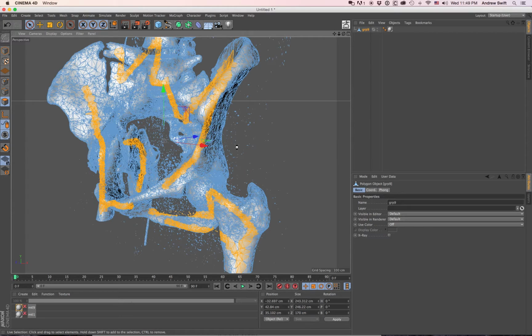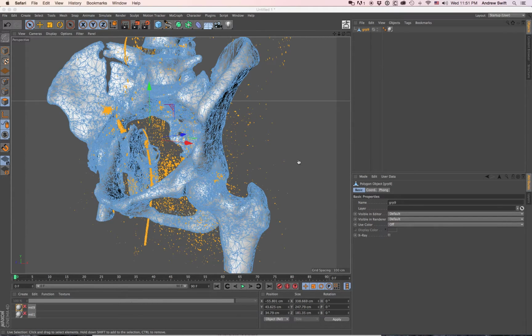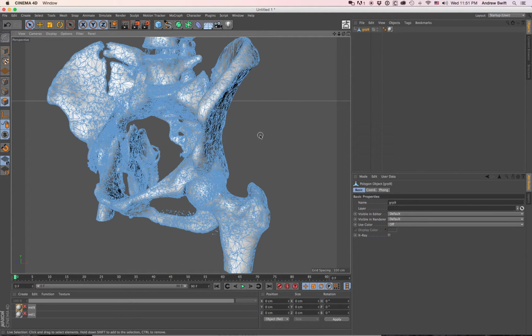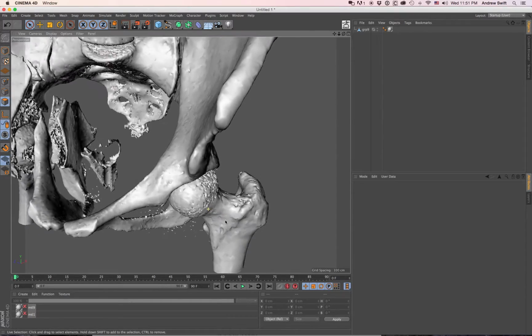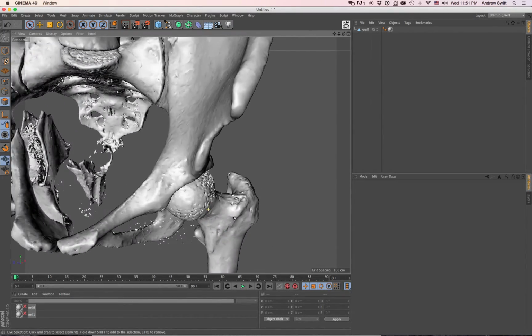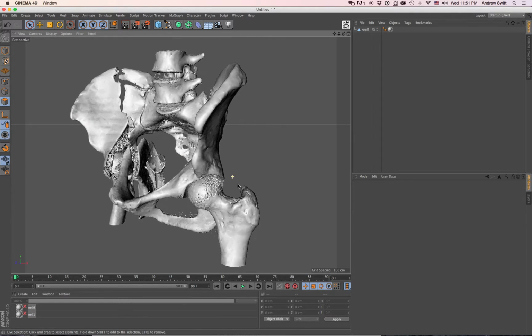Okay, I have it finished, and what I did was I selected the inverse, and now I'm going to hit delete, and that should lower our polygon count considerably. Let's see here. It takes a while. It's a lot of data. All right, and so now this is what we're left with, and you can see there are some of the stuff down here, it's not perfect, but for the purposes of demonstration, it'll work fine.